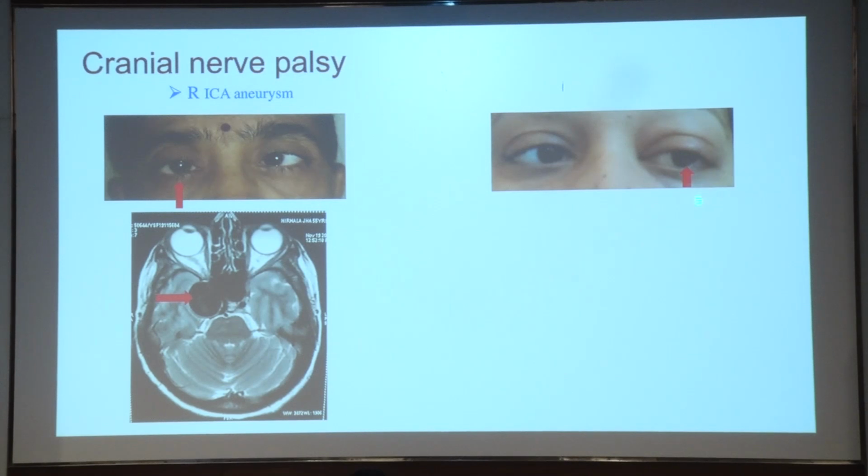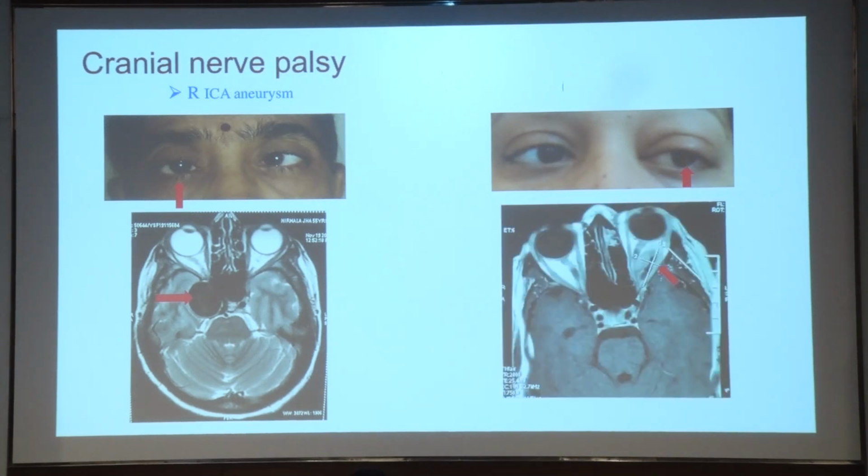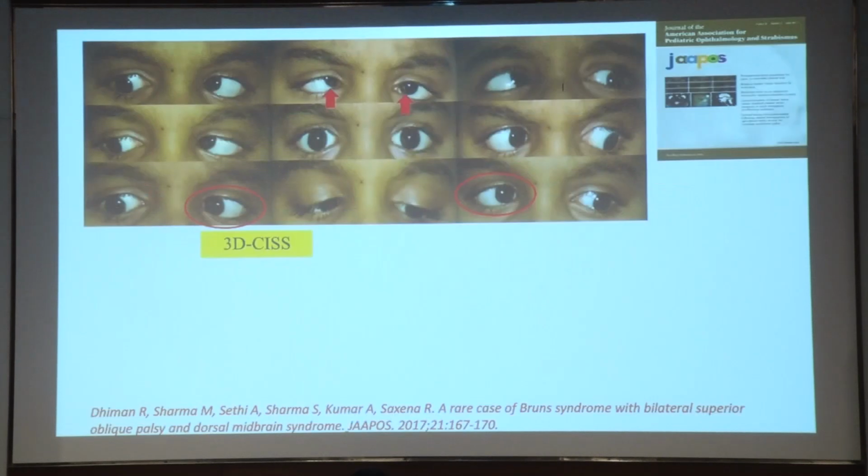and conjunctival congestion. So this tells you something is in the orbit, or nearby. So what we did, and we found that there's a LR cyst. So it's a case of LR cysticercus.